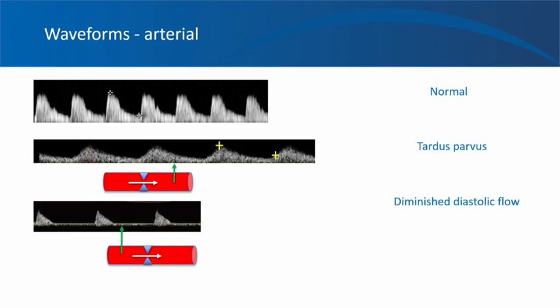And during your renal sonogram, if you look at the blood flow in the distal vessels and it appears like this, there might be a problem proximally. And what if you see this kind of waveform while measuring your resistive indices? See here, there is no diastolic flow at all. This is a systolic wave here, and you see a big gap instead of diastolic flow.